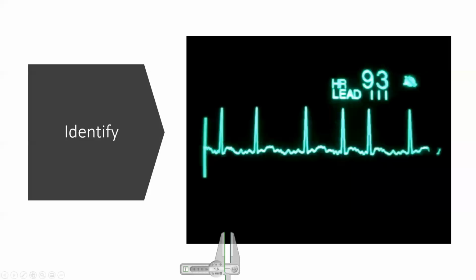Okay, so everyone had said that this is atrial fibrillation. So I guess everybody is aware of what atrial fibrillation is. But just as a review, I wanted to tell you what the characteristics are for atrial fib.